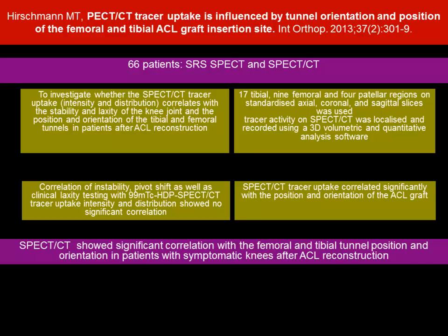So he tells the reporting people whether the uptake is normal, physiological, or the expected uptake you will see in a particular surgery. If you know that, then it's easy to differentiate physiological or benign uptake from loosening or infection.